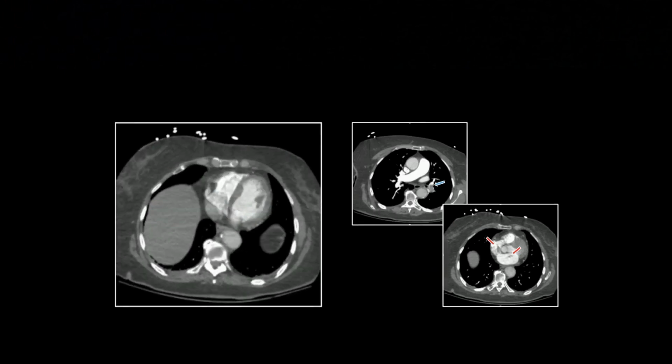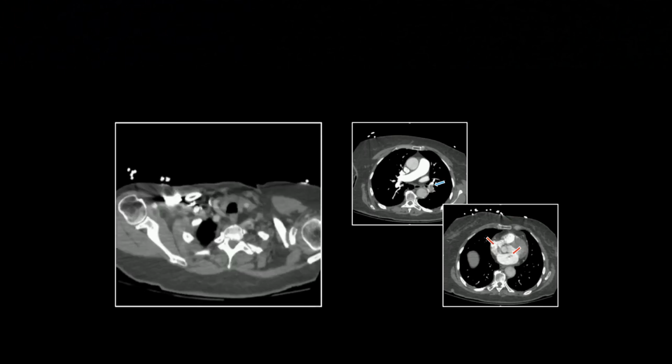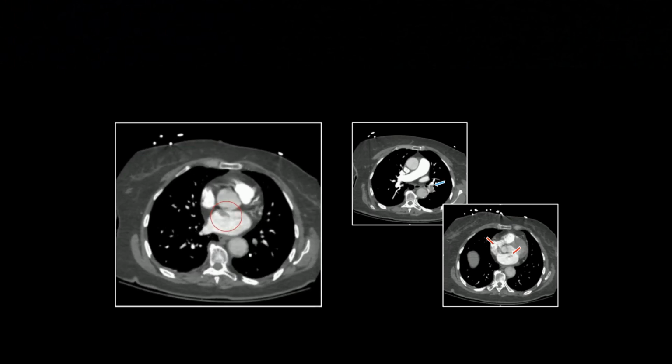Right there. Wow. The timing required for this thing to have happened is amazing for us to get this scan.